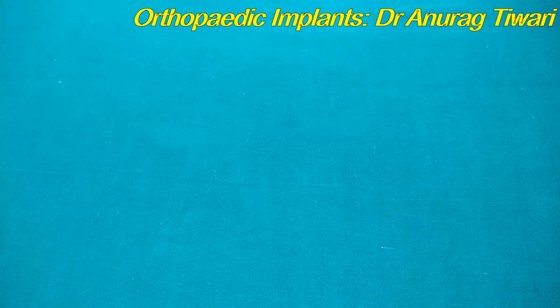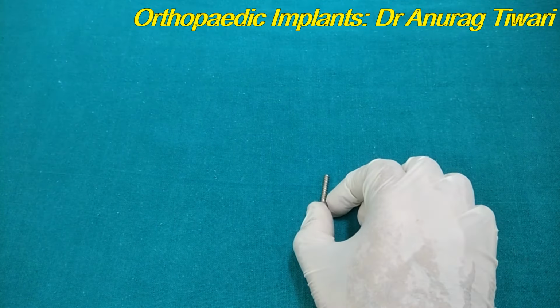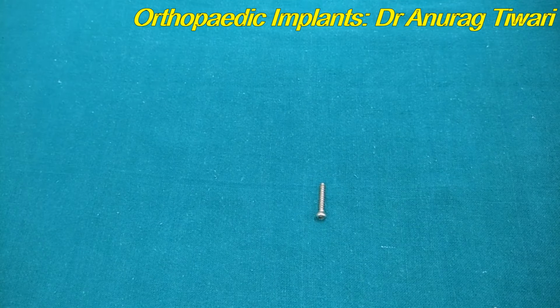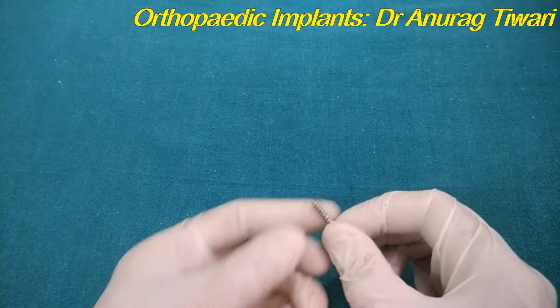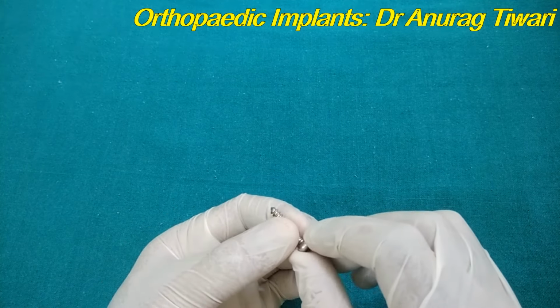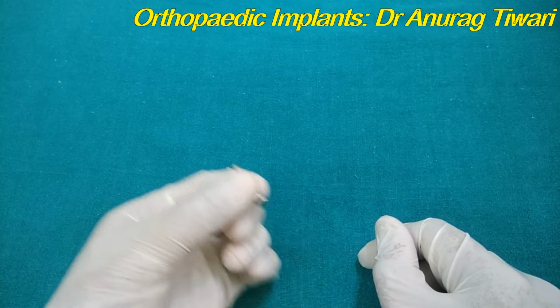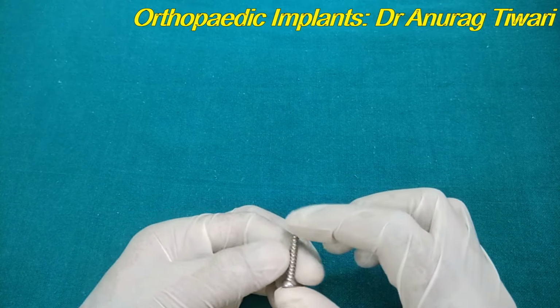So before starting, the basic unit, or the basic implant, is the screw. The screw we define as the mechanical device which converts the rotational forces into translational forces. So when we rotate the screw with the help of a screwdriver, it translates forward. That is the rotational force getting converted into the translational force.